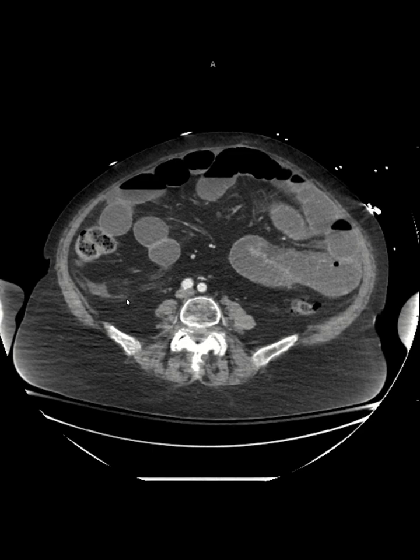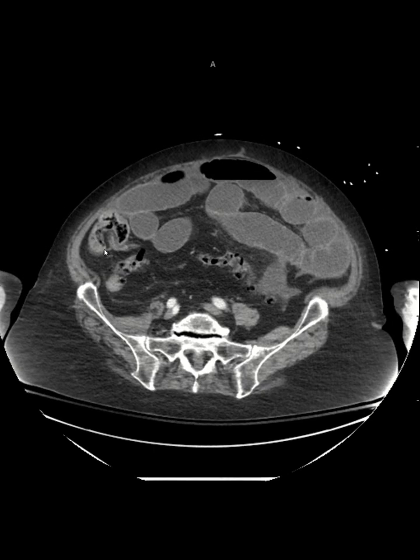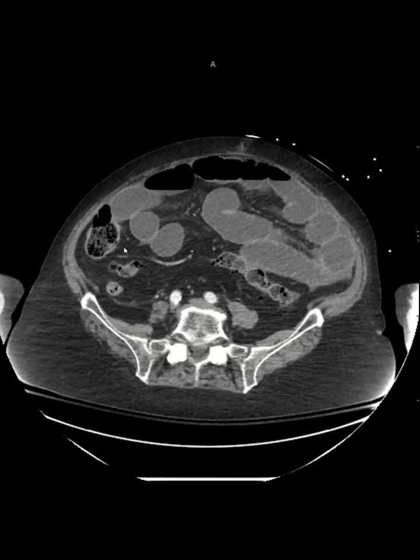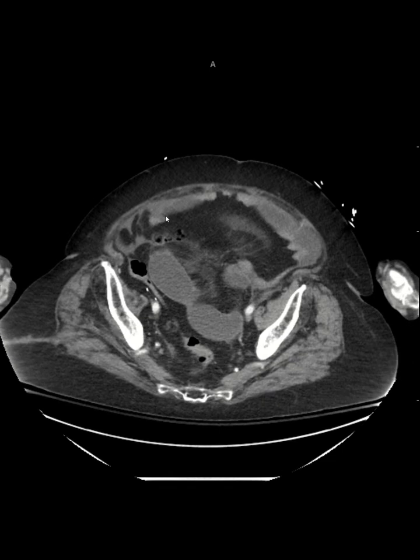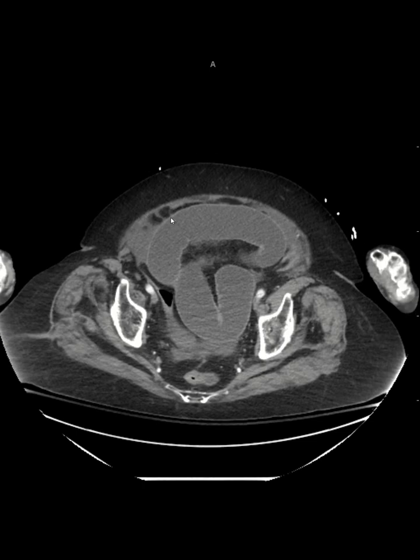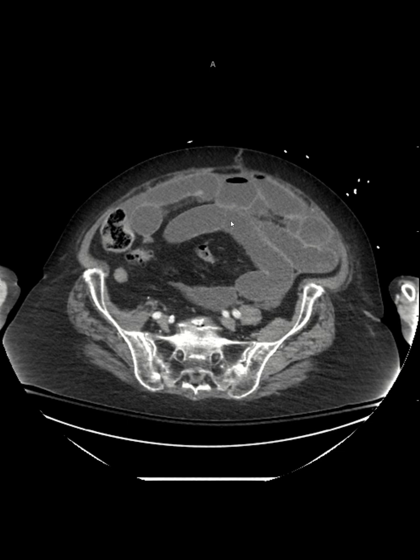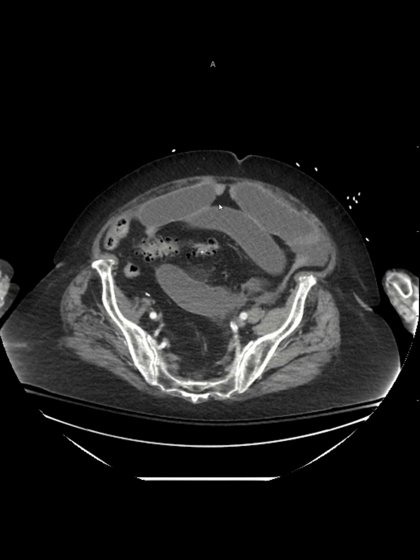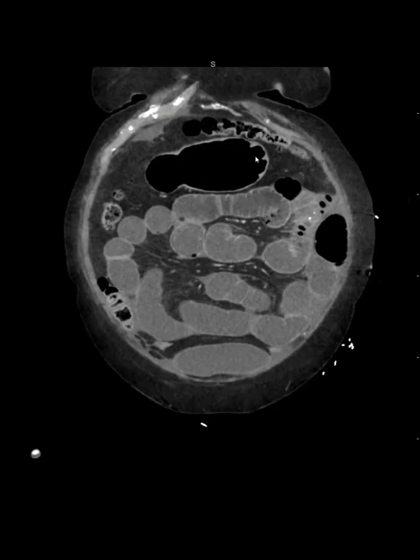back into the ascending colon, this is the ileocecal junction. There's always some fat at that location. And this is the terminal ileum, and we're going back following the distal small bowel. It's all collapsed. So somewhere between these dilated loops and the collapsed loop of small bowel, there is a transition point. I like scrolling through the coronal images to find the transition point.